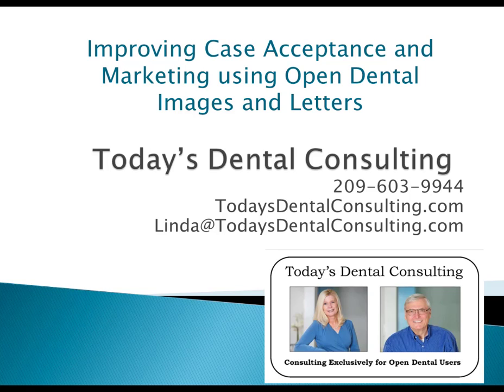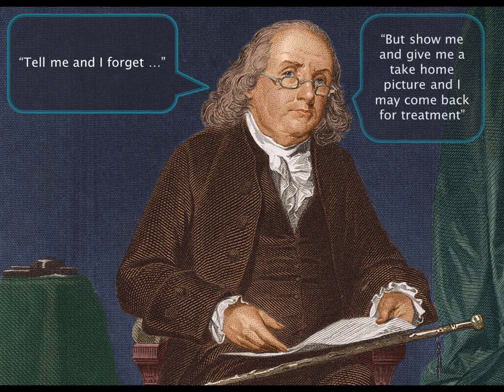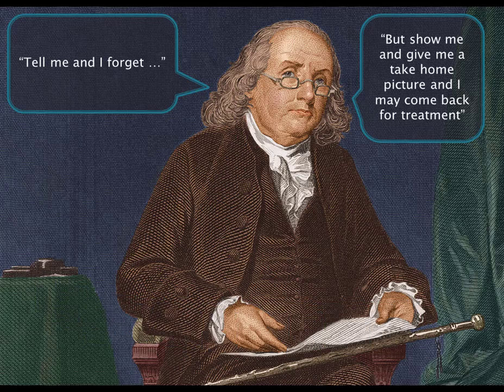In this video, I want to talk about using Open Dental images and letters both to improve your case acceptance and also in your marketing. I'll show you where you can download the Open Dental setup files when we get to the end of this video. To paraphrase Ben Franklin, if you tell me, I forget, but if you show me and give me a take-home picture, maybe I'll come back to have the treatment done. This, in a nutshell, is what we're going to talk about.